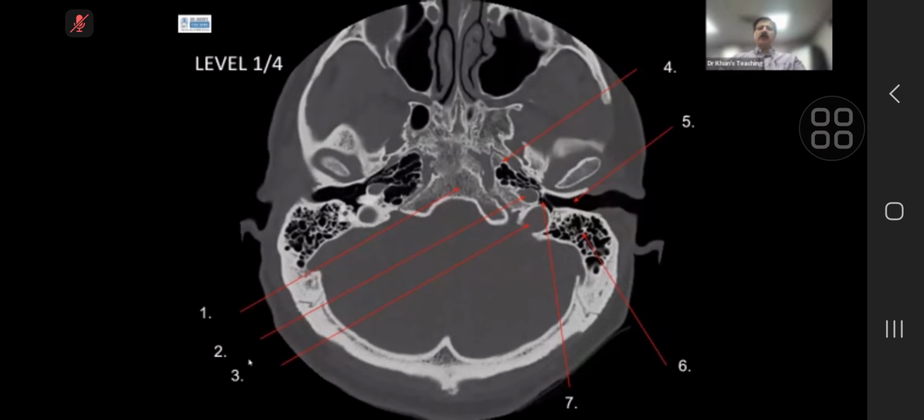Good. Number 2. Okay. I'll give you the answers in the next slide. Number 3, what is this? Number 3.